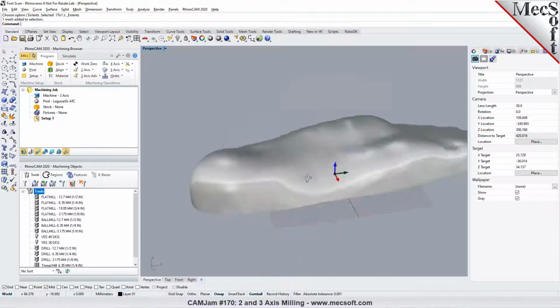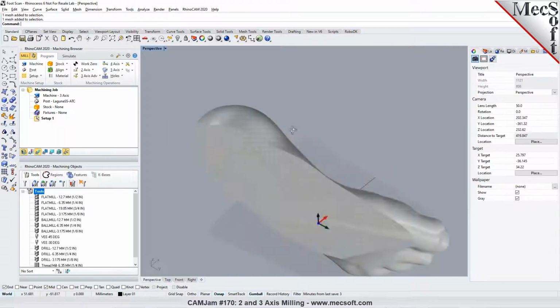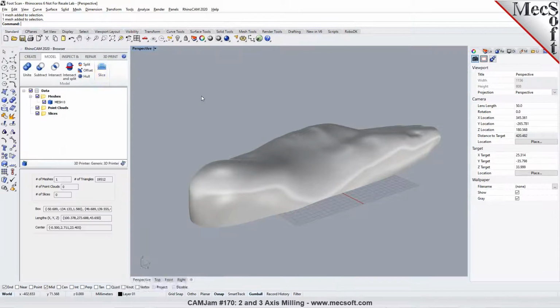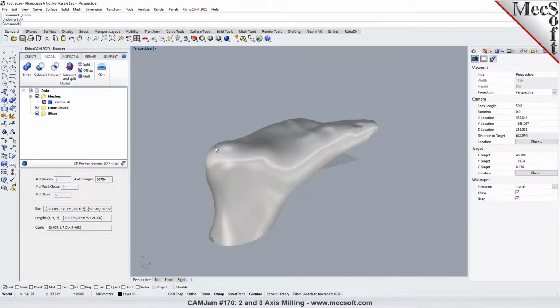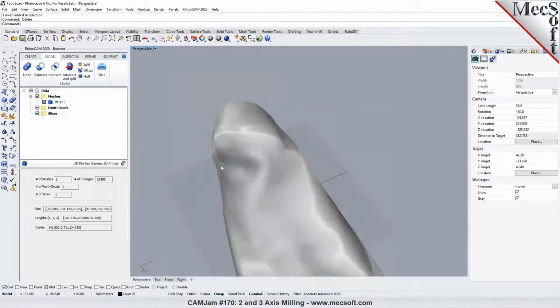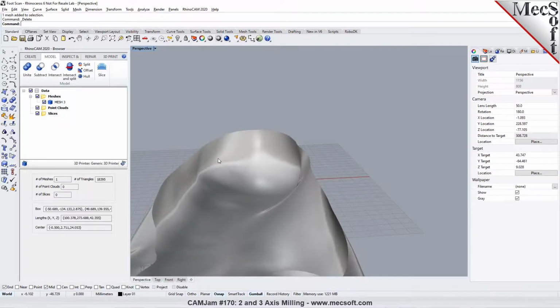Okay, so you will have to do all of those edits in the CAD itself, in Rhino. You may have to do some splitting and then machining it, because right now it's one single mesh. Let me go back in here to the mesh module. Let me undo what I just did. So if I do a split, I can pick this and pick where I want it to be split right here, and I can say okay. Do not cap this. If I say do not cap, it's going to leave the lower inside section hollow.